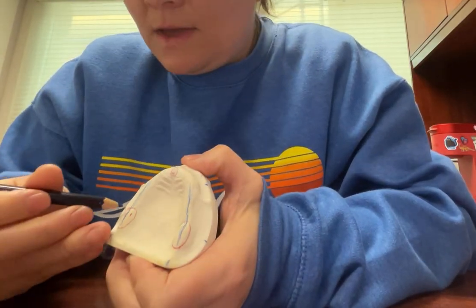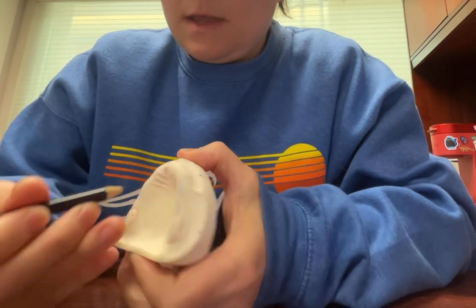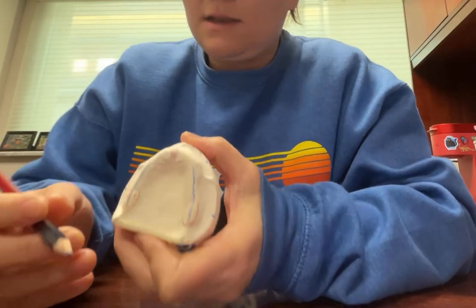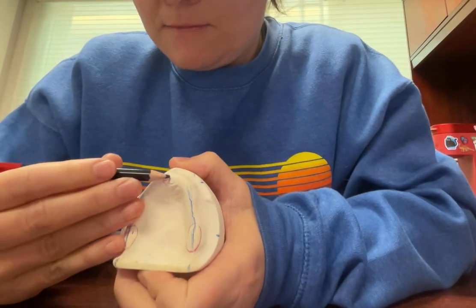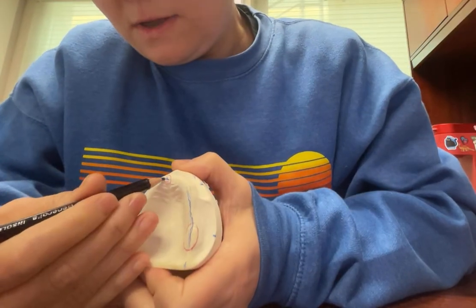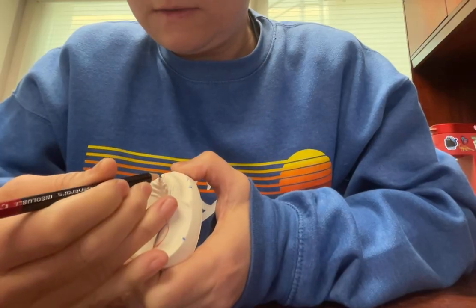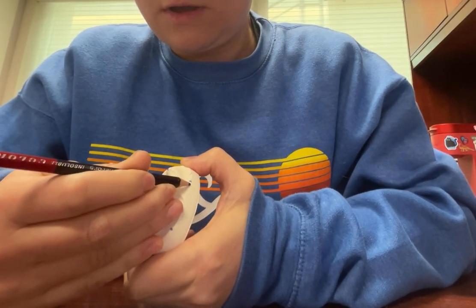The other lines that we have, I mark the anterior portion of the tuberosity on this side and the anterior portion of the tuberosity on this side, and that's going to help dictate where our posterior teeth stop. Last but not least, we're marking through the center of the incisive papilla, and we're carrying that line across. You can use your ruler to help guide you. Carry that line across to the land area on either side.